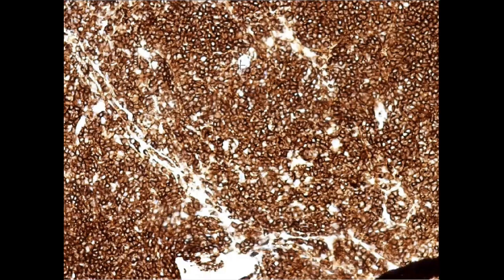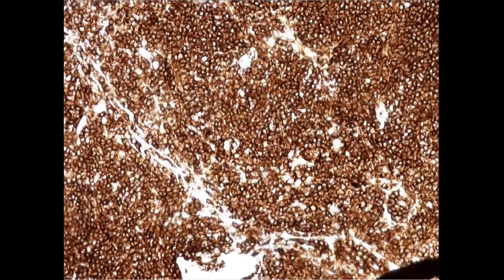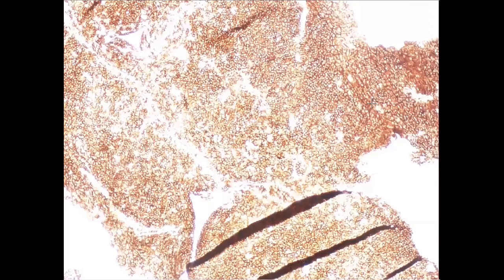But look at this gap. It's very wide, it's very large, and it's not taking the stain. All the stain around it is just the stain of the other cells surrounding it. Look at this cell, how it's big in comparison to the surrounding cells. So this one is not taking the stain, it's just surrounded by stained cells. I'll try to put it on a lower power. Maybe we can appreciate it more.